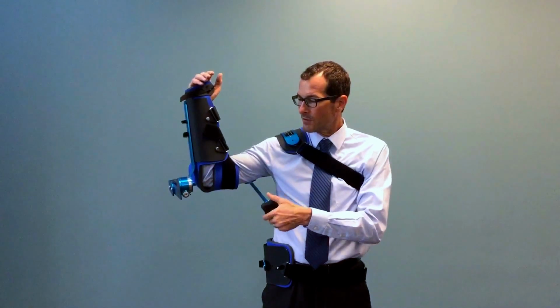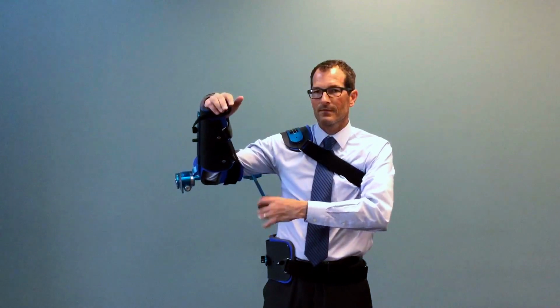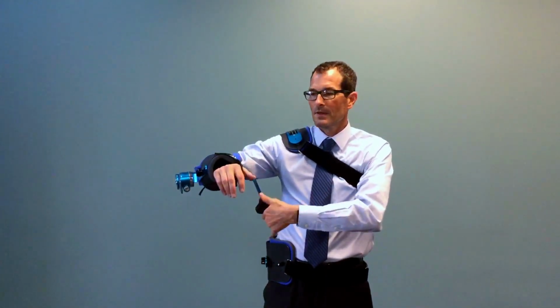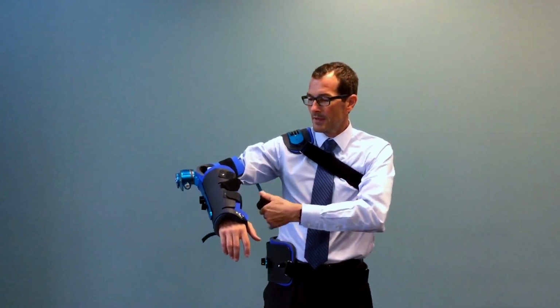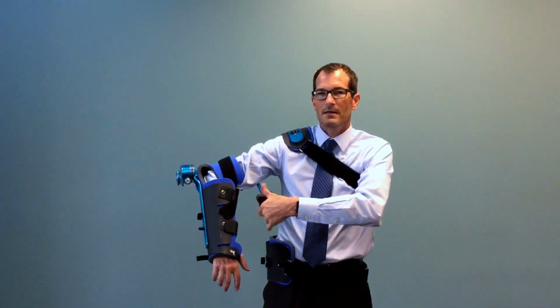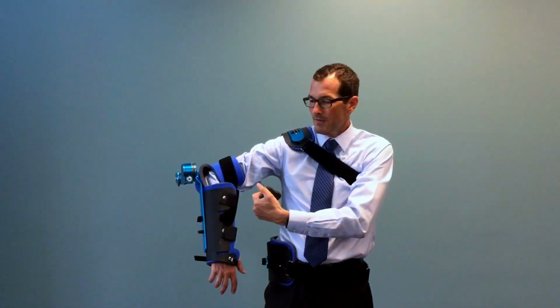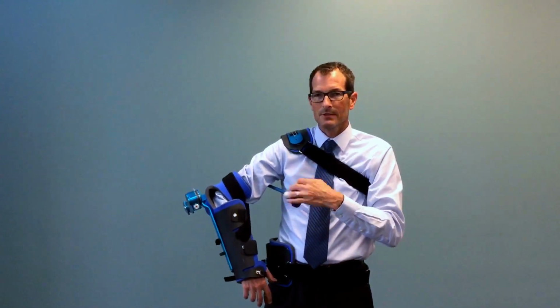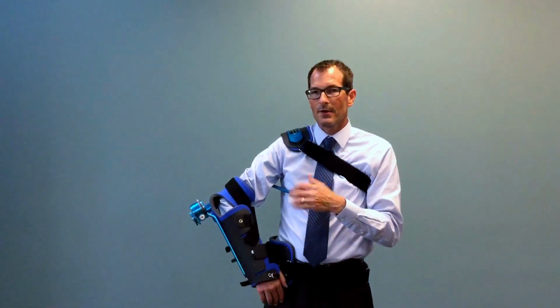So shifting back down towards my elbow, I'll show you internal rotation on the product. We need internal rotation not only for those sporting activities, but also to tuck our shirt in, to get a wallet out of our back pocket, those types of activities of daily living. And so the product certainly addresses internal rotation as well. Moving the spindle back towards my armpit, I'll bring myself back into adduction and bring the position of the product back into about 30 to 40 degrees.